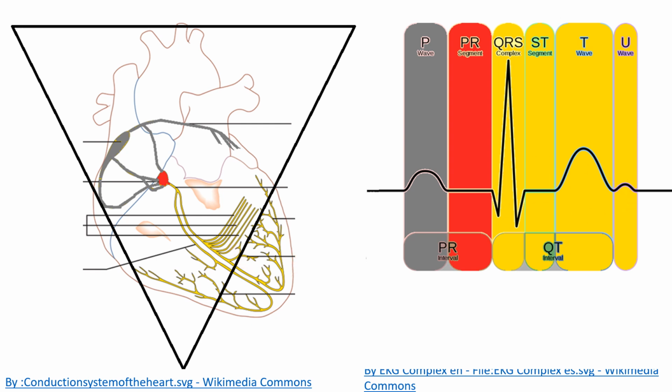All right. So what's happening with the atrial pacing is this thing should be firing 1, 2, 3, fire, 1, 2, 3, fire, 1, 2, 3, fire, right? And it should be firing at a rate of 60 to 100 beats per minute. Put another way, this should be firing once every second to, we'll say, roughly once every half of a second, right? And so you get how quick this should be going.